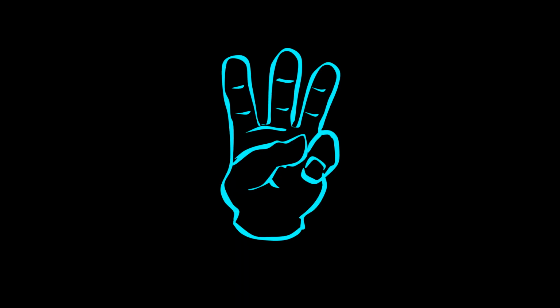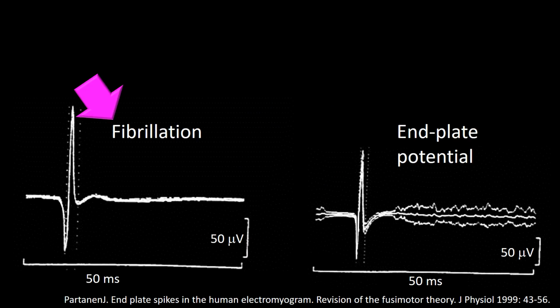The third finding that distinguishes fibrillation potentials from end plate potentials presented in the figure used in this question is the most obvious. Fibrillation potentials have a flat baseline, whereas end plate potentials have wavy baselines. The wavy lines can be easily appreciated in the 3 superimposed end plate potentials shown here.